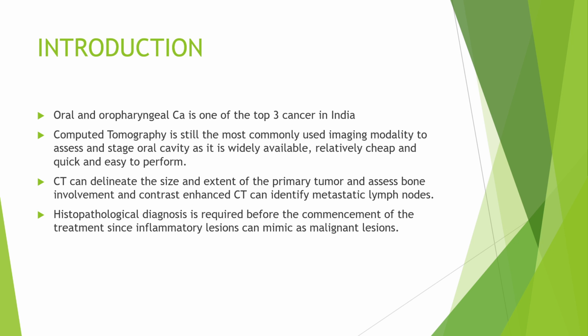Oral and oropharyngeal carcinoma is one of the top 3 cancers in India, and CT is still the most commonly used imaging modality to assess the stage of oral cavity cancer. It is widely available, relatively cheap and easy to perform. CT can delineate the size and extent of the primary tumor and assess bone involvement, and contrast enhanced CT can identify metastatic lymph nodes.